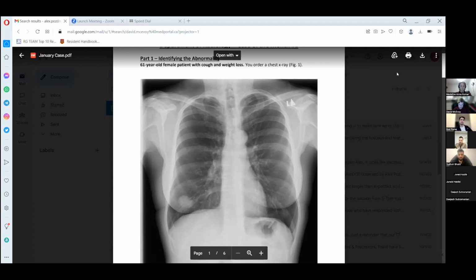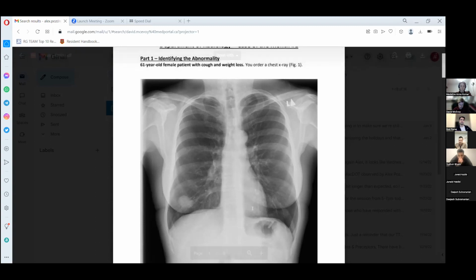This is more going to be up to your habit or your preference, but generally speaking, we can, for example, start looking from the center and go outwards. So usually in the center we have the heart. So this is the heart contour.